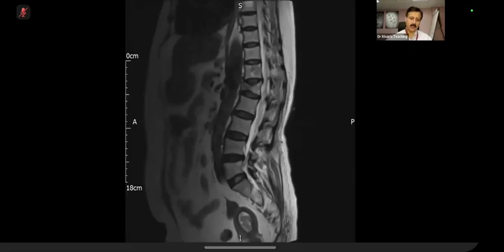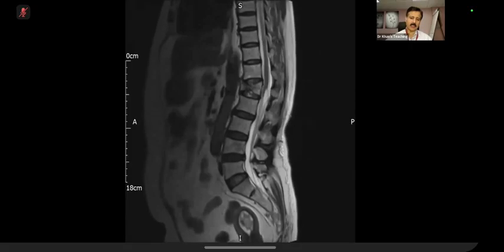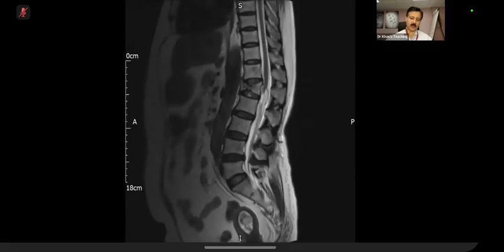Okay, I'll take over. You see, the teaching points here are, first of all, this was well picked up, the endometrial, this was an incidental finding. Any endometrium which is more than 4 millimeter in thickness in postmenopausal, call it. And MR is not the correct answer. The correct answer is I will refer to the gynecologist for hysteroscopy.